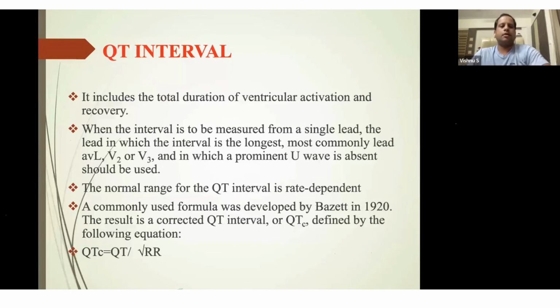First, in a patient with prolonged QT, how will you assess the QT interval? The QT always depends on the heart rate. In a high heart rate, you have to correct the QTc for the heart rate, because this ventricular depolarization varies beat to beat.